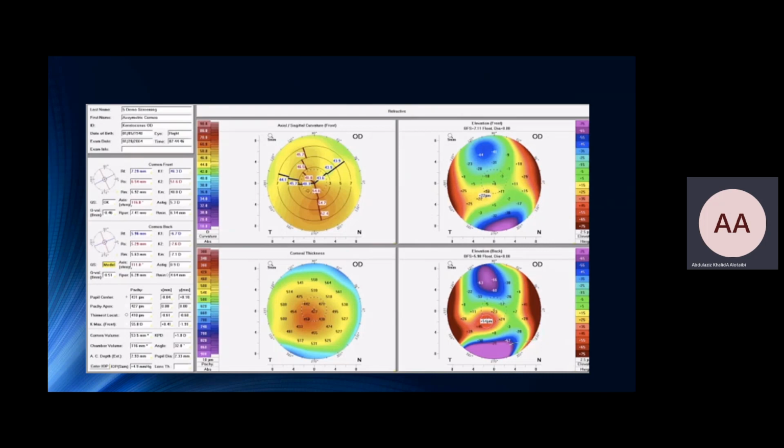Then I look at the thinnest location, which is 418 micrometers, and it is displaced at about minus 0.68, which is considered to be suspicious. Okay. Correct.